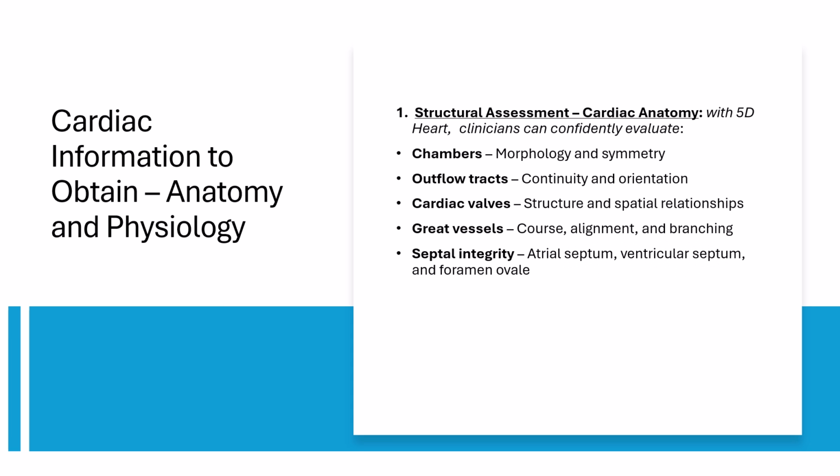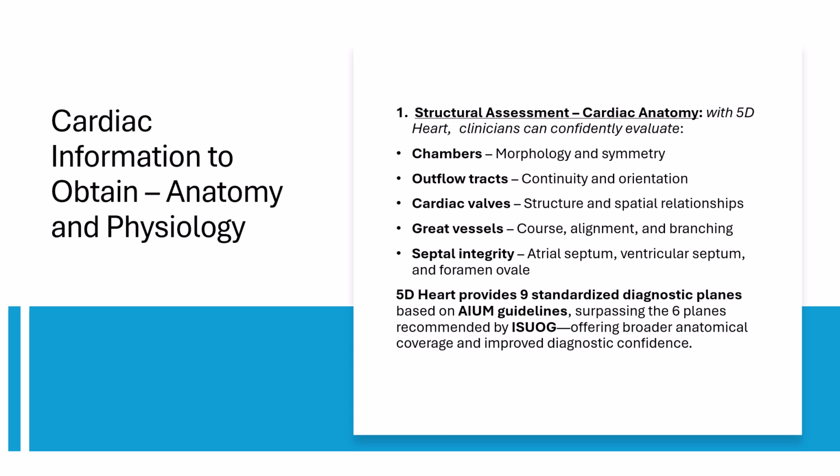Septal structures, evaluating the atrial and ventricular septae, as well as the positioning and patency of the foramen ovale.